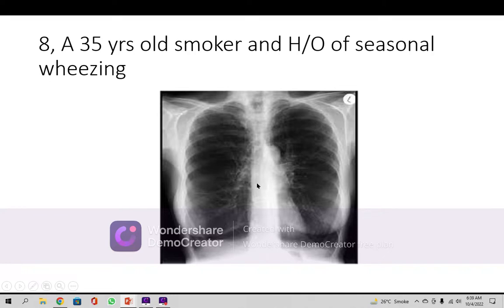These are the findings, and on the basis of these findings and the scenario provided, this is COPD, with a polar end of emphysema, dominant emphysema. Other investigations you will do: possibly HRCT can be done, sputum should be sent for AFB, and we usually do that in our country specifically.